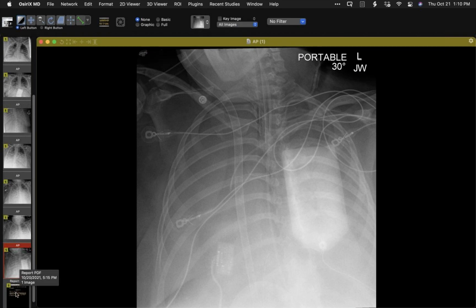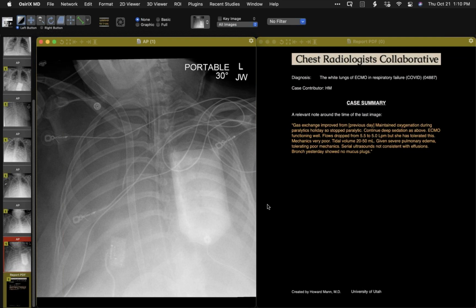And she's being treated with that. You can see at one point in time, close to around this time, the tidal volume actually given is very small. And the prognosis presumably is rather grim. So just the white lungs. You don't have to have obstructive atelectasis, as you can see there. It's presumably just consolidated edematous and eventually just not aerated lungs.